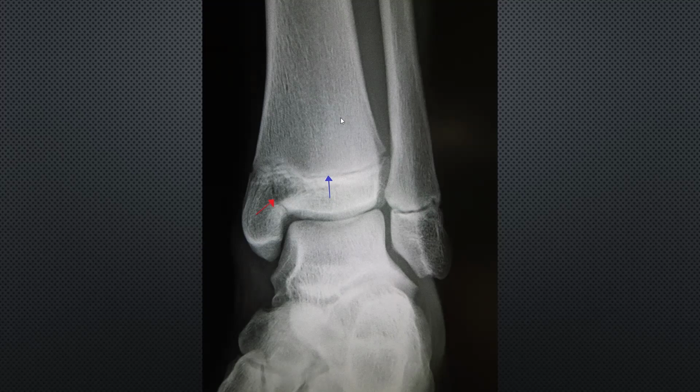Accurate or inaccurate? Not accurate, no information. Adequate or inadequate? Adequate, because you can see all the ankle. I don't care about the foot. I can see the ankle, above the tibia and the fibula, and below the foot, and here the soft tissue. Everything is clear for the ankle, so this one is adequate.